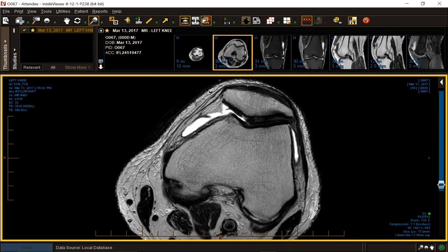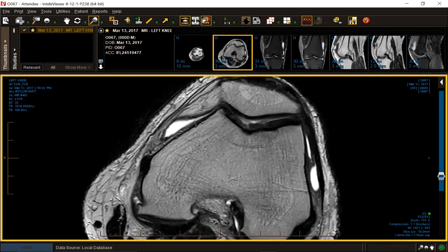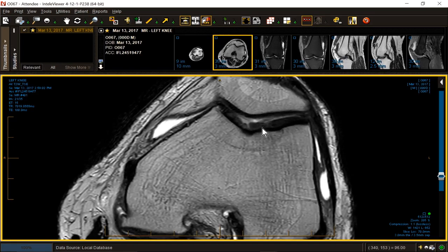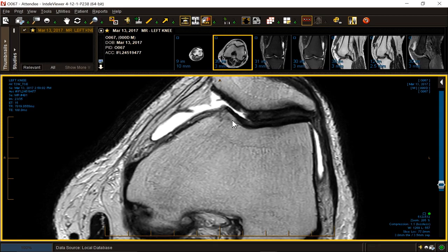It goes down to the osteochondral plate, this black line, which represents cortex and plate. It's a full-thickness ulcer. It explains her pain, as does the trochlear erosion underneath it. Some trochlear chondromalacia, a little more subtle laterally, not so subtle in the middle, not so subtle medially.